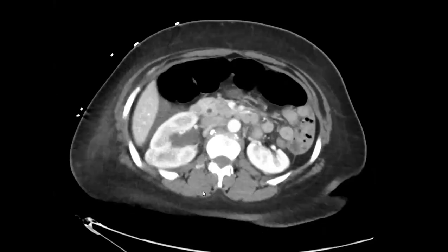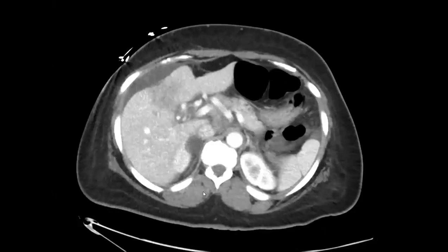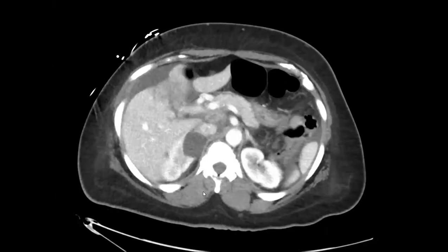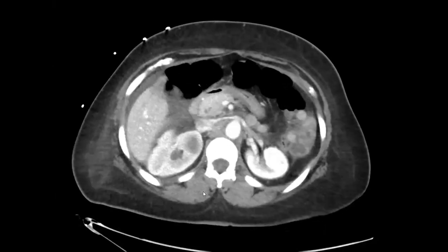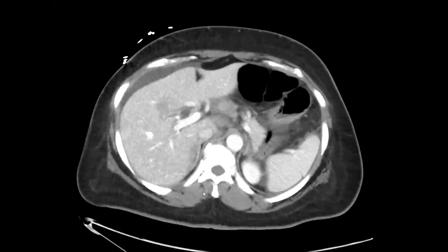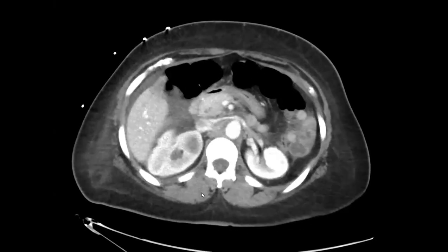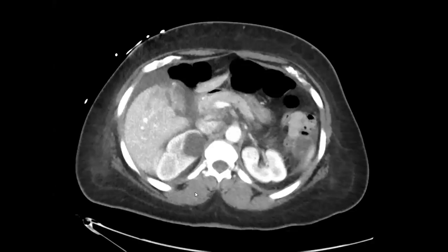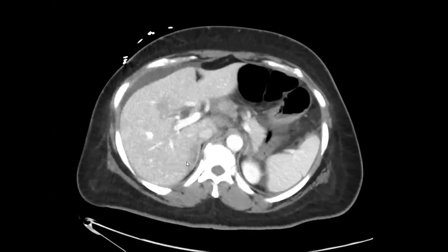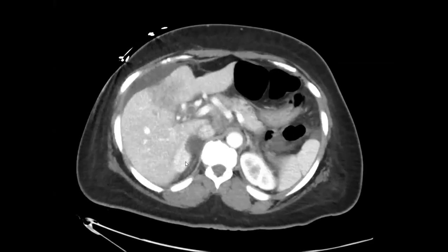What's happening in the liver? What is that? It's like a mass. There's capsular retraction and not geographic kind of hypoenhancing, but it's irregular. There's all this fluid. Okay, so I told you the history was aborted cholecystectomy, excuse me. Aborted cholecystectomy, because it was heavily calcified, adhered to the liver.